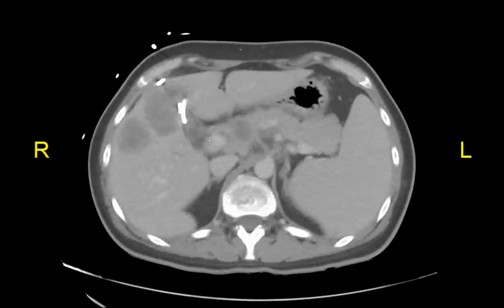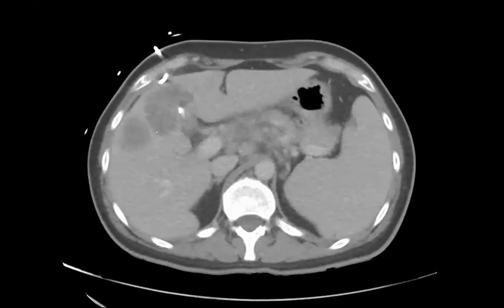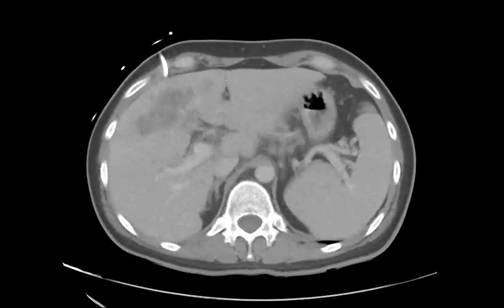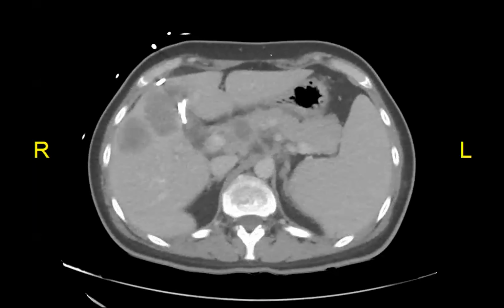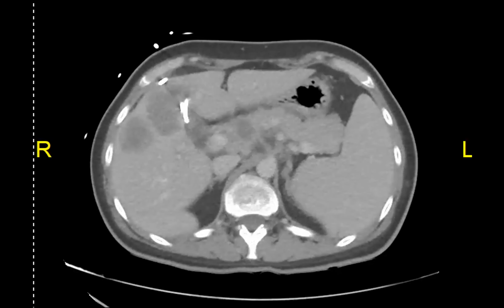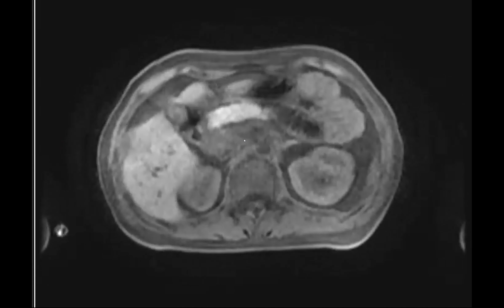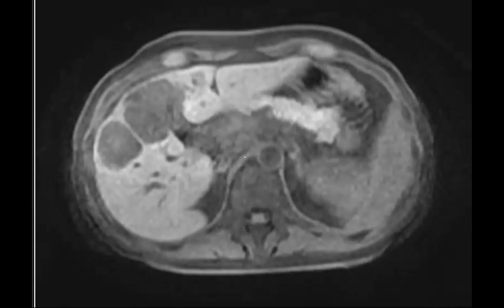Yes. Okay, so this is the cholecystostomy tube, it's in a decent position. At this point, this was read as gallbladder decompressed and there are liver abscesses. You can see that. And no lymphadenopathy, this was read as. So the patient was still complaining of abdominal pain, the drainage kind of stopped, but he wasn't feeling all that great. Then he got an MR a week or so later.